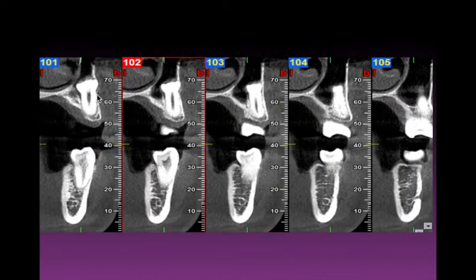Impacted teeth could now be assessed more than ever, as what this series of cross-sectional cuts would show. It now gives us ability to determine how close it is from one side or the other. So in this particular case, it doesn't just simply tell me and confirms that this particular impacted tooth is inverted, the crown is located more superficially or coronally than caudally in comparison to its apex. The apex is more caudal than your crown.